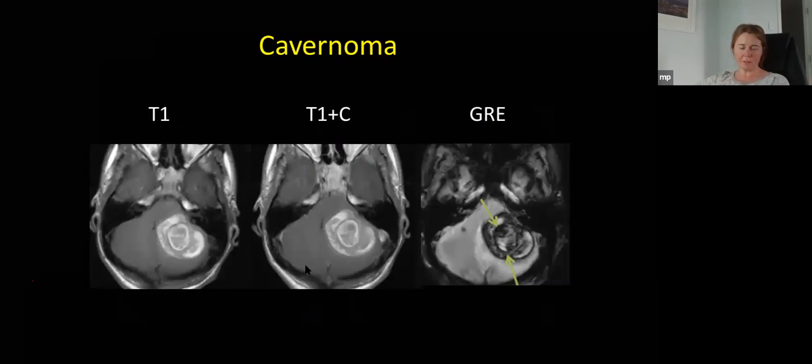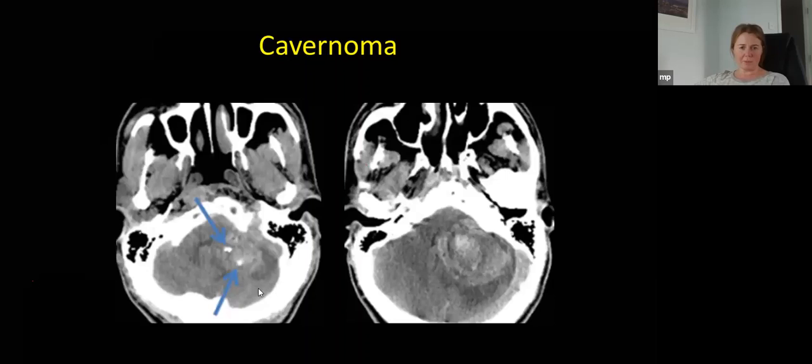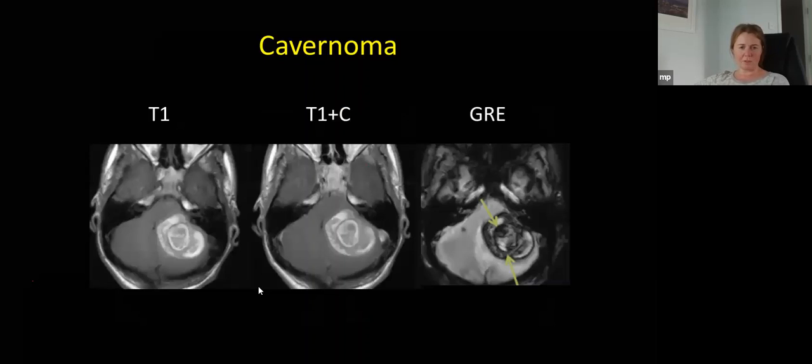So the reason for the edema in this case is because this looks like this patient has actually bled. So they've got high T1 intrinsic signal, but also this other signal. This is post-contrast. You can tell this is post-contrast primarily because of the nasal mucosa.